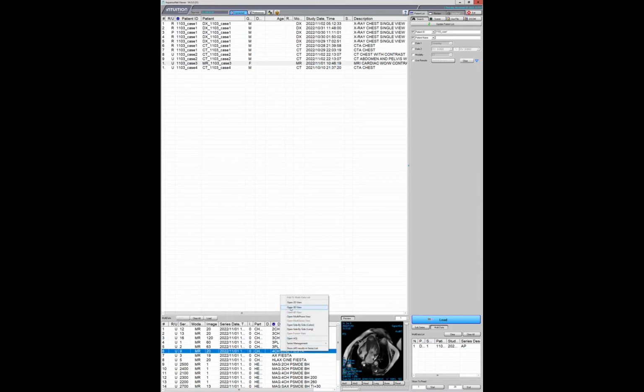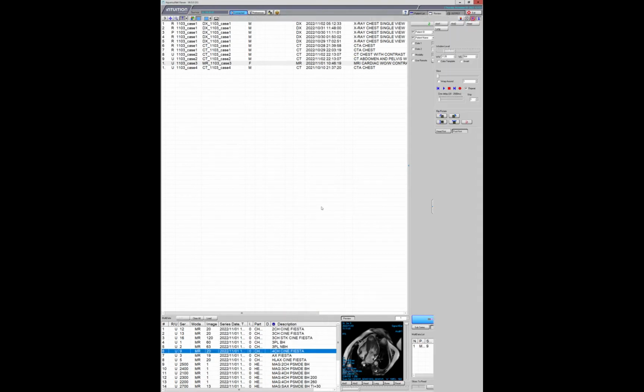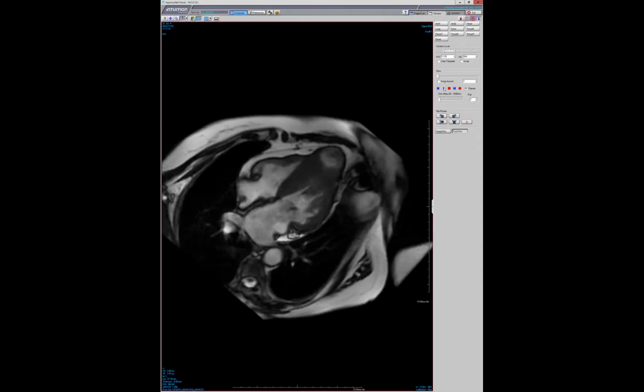Okay. So this is nothing special. It's just a very nice example of people who have apical HCM, and there's a small portion of the apex which is spared from that thickening. You can also see there's even HCM involving the RV, which is not uncommon with the apical variant. So it's not uncommon to have some thickening of the RV.